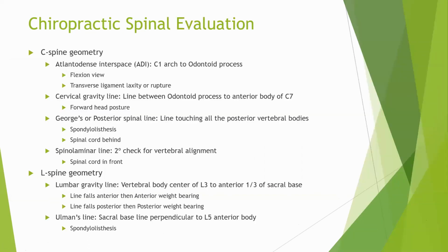This is an extremely nice quantified value that you can use as an outcome measure, either in your research or in your clinical practice, to check for forward head posture. After your treatment, you can see whether the forward posture has been corrected. This is a beautiful, quantifiable way to evaluate that.